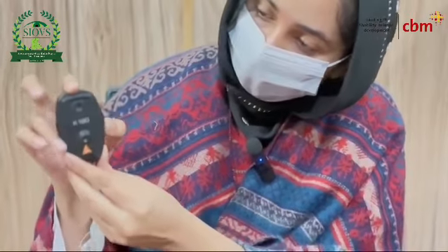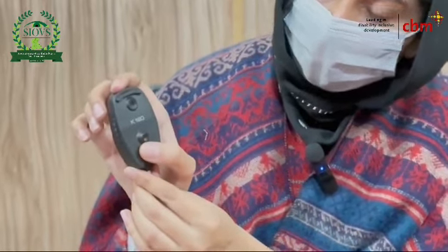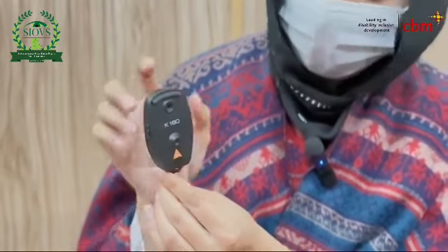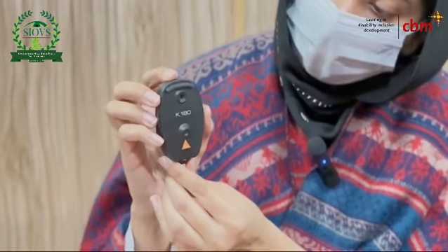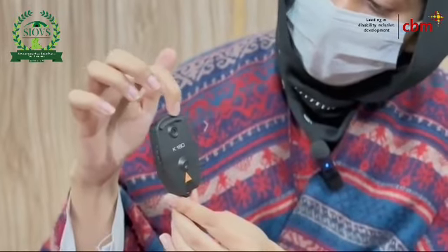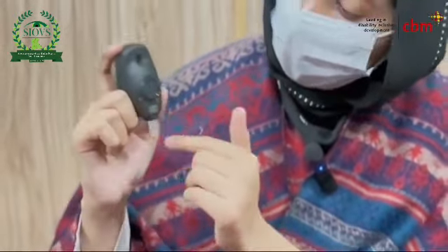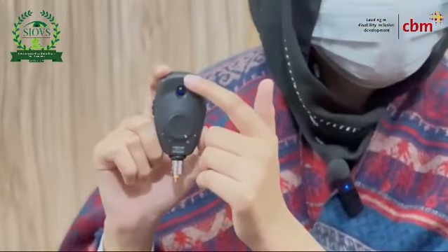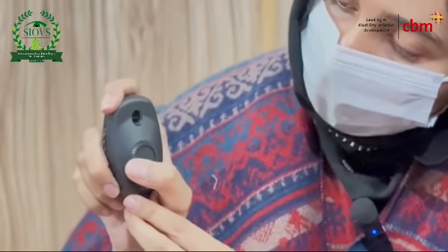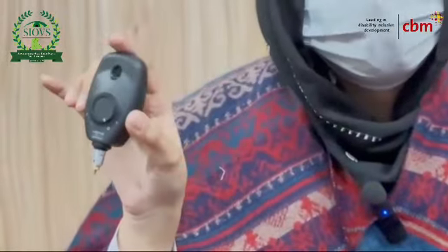This is the dioptric power display. Here the powers of the lenses are shown, and in this way we set the power. Clockwise, the powers are plus numbers, and anti-clockwise, the powers are minus numbers. This is the brow rest and this one is the viewing window of the examiner side. Now the patient side. This is also a viewing window on the patient side, and this is the filter changer and aperture changer. So this is the overview of the direct ophthalmoscope.